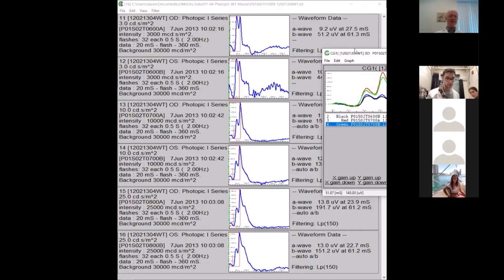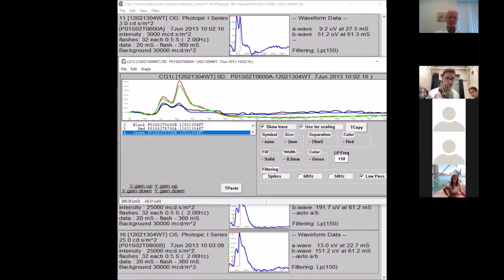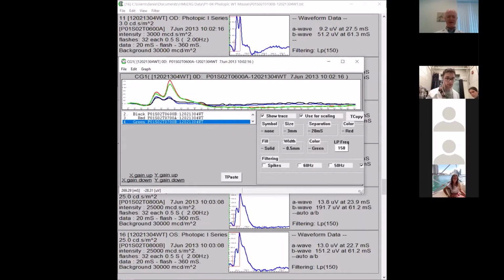I see that. Let me move this over here. I think you may be getting a little cut off here. There you go. All right, how's that look? All right, there's a good example.